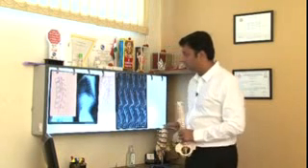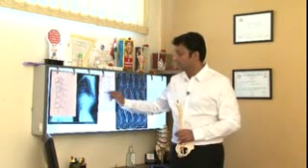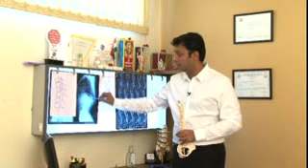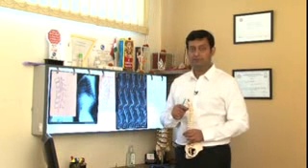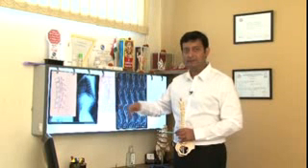These are spinal deformities, the kyphoscoliosis. One of the ideal investigations is the X-ray, very important, and the MRI scan. So if you see here, this is how the X-ray looks. Almost 100 degrees of angular kyphosis, where there is an anomalous vertebra at D10, D11, D12, all of abnormal shape. But the most culprit which is causing the problem is the D12 hemivertebra, an anteriorly deficient vertebra, leading to the posterior internal gibbus, which is causing compression over the spinal cord.